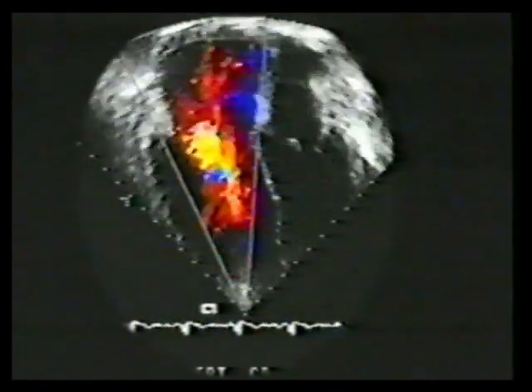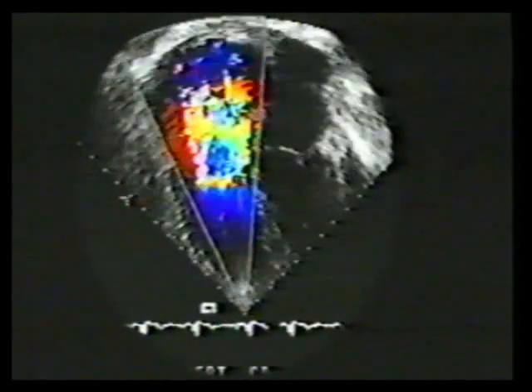Having discussed the use of 2D echo in delineating morphologic and functional disturbances associated with pulmonary and tricuspid valve disease, and the use of Doppler to define right heart hemodynamics, we will conclude this portion of the video program. We will proceed next with a discussion of echocardiographic assessment of diseases of the aorta.